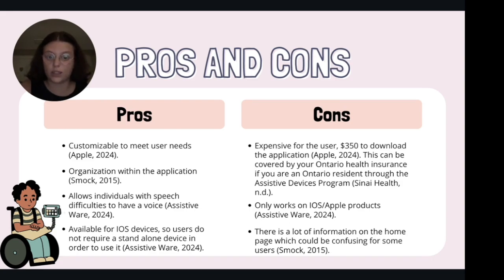Some of the cons include that it is expensive for the user. It is $350 to download this application. However, this can be covered by your Ontario health insurance if you are an Ontario resident through the Assistive Devices program. Another is that this only works on iOS or Apple products, so if you have another type of device, it will not work for you. And finally, there's a lot of information on the homepage, which could be confusing for some users to navigate alone.